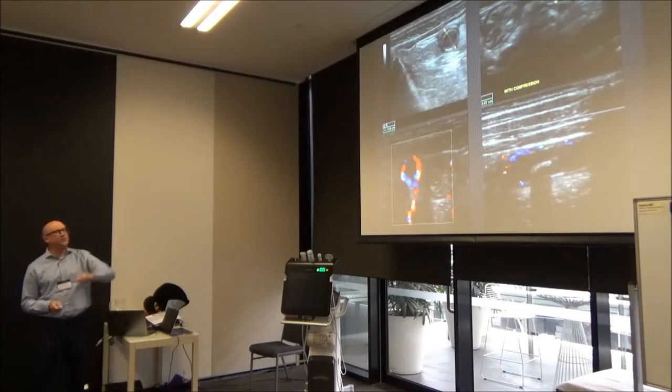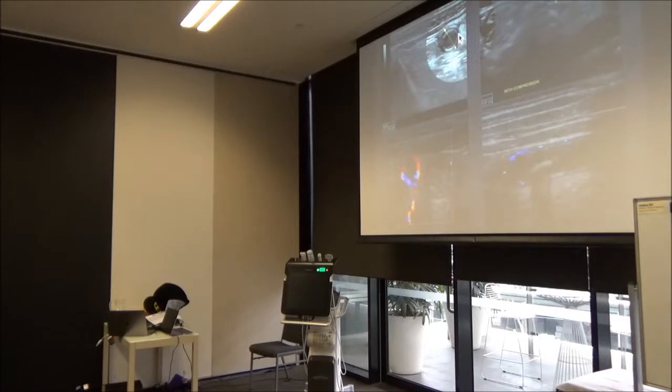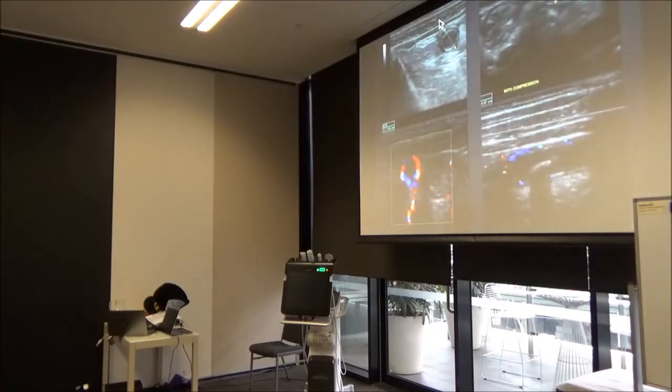All four of these pictures here are all pediatric appendicitis. These were all kids. But you can see this one in particular has a very nice, very prominent submucosal layer. Here's some periappendiceal fat right here, hyperechoic periappendiceal fat. Perhaps some more periappendiceal fat here. Yep, here's psoas down here, and then abdominal wall musculature up here. That's a really pretty one here. This is in a longitudinal plane with its appendicolith seen here as well.